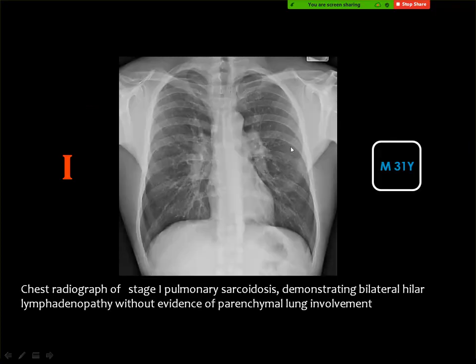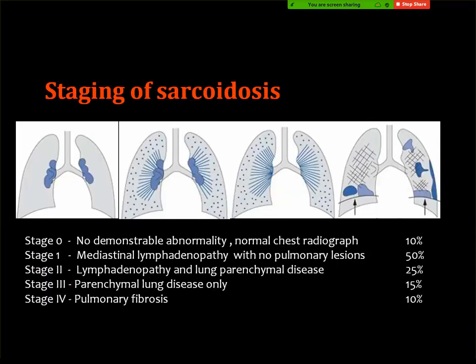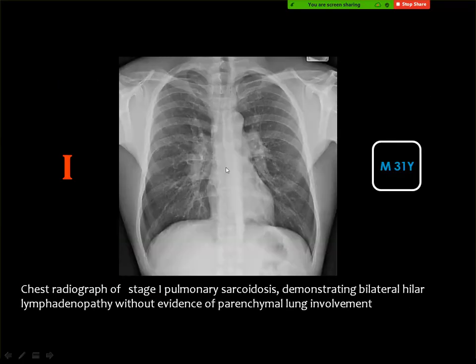Then stage 1, you get lymph nodes. Doctor, is this case stage 1? Yes, this one. This one? Yes. And this is the stage 1 sarcoid. Okay. Then this is also stage 1.